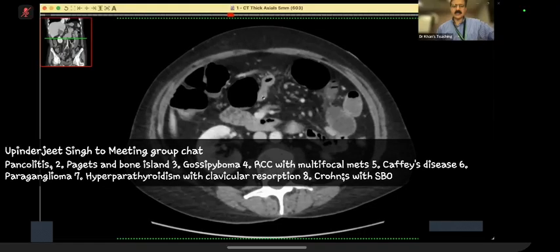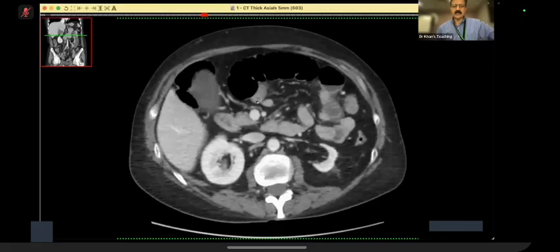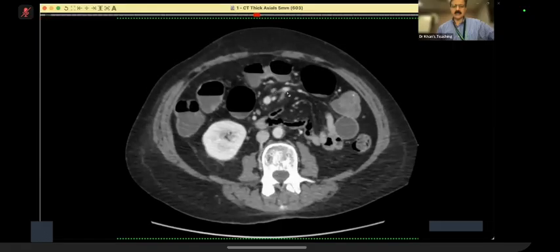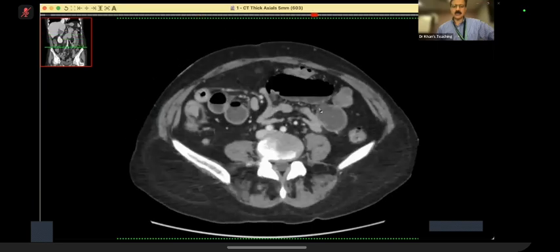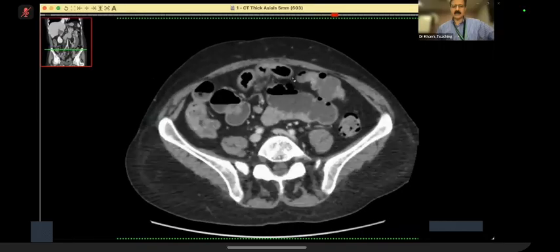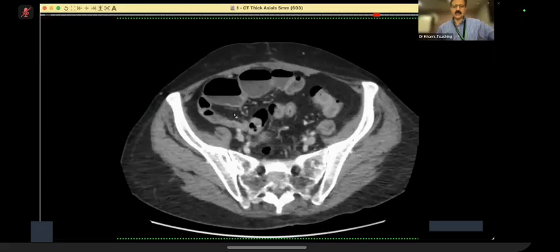As I am tracing it here, one can see that there is as if a transition point, and then it becomes slightly better. Now, similarly, there are other transition points. Look at this one. Look at this one. I'm picking them up randomly. Look at this one. There is something wrong here, and then look at this loop here.